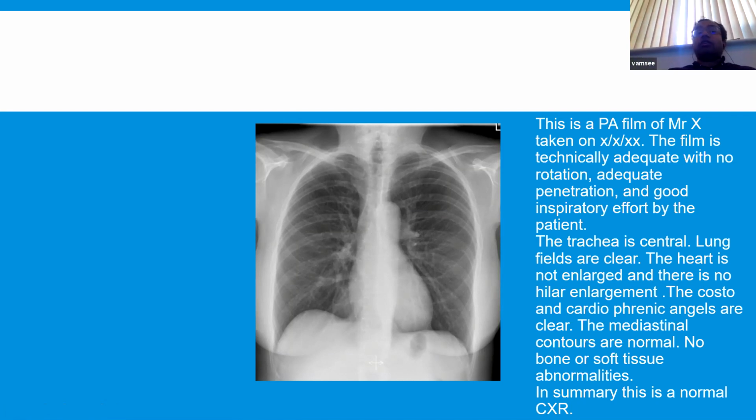But you might be given that in an exam, and even if you're not, it is worthwhile developing it as a habit to just say, this is a PA film of Mr. So-and-so or Mrs. So-and-so, taken on whatever date it is. Now, then comment upon if the film is technically adequate.